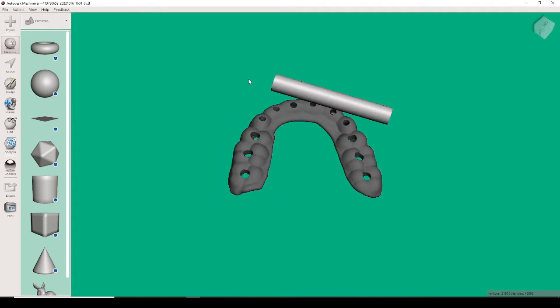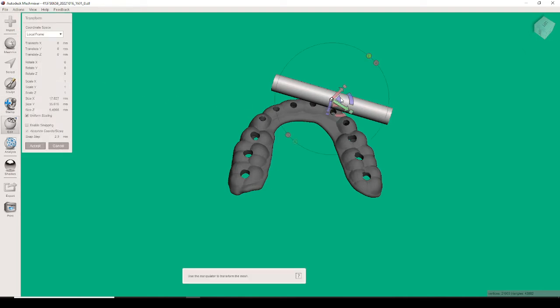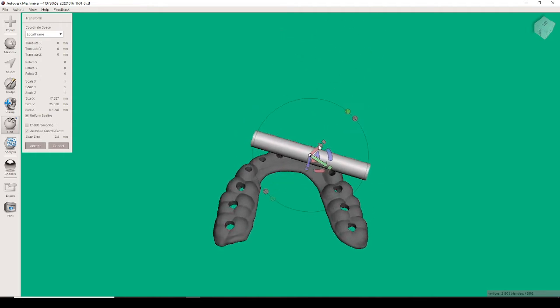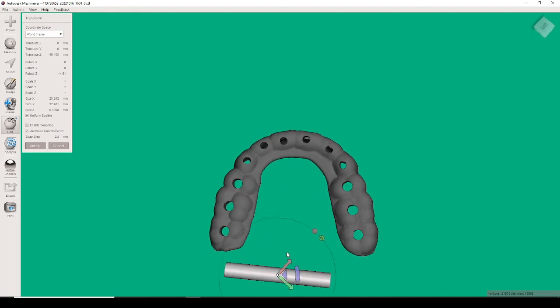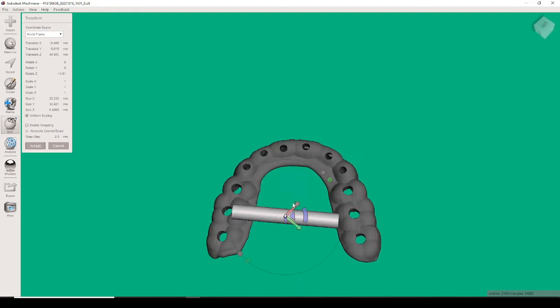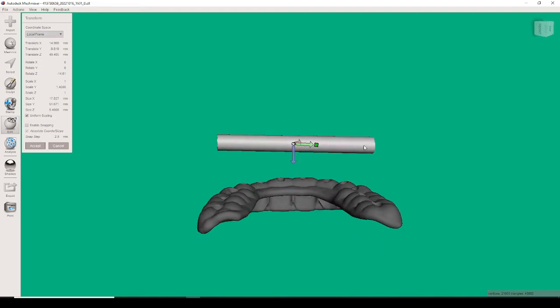All right, but for now, let's bring in this bar. So let's edit. I press T, which stands for transform. Change that to this different orientation a little bit. Bring this into the area which I want. For some reason, when I do this, it doesn't work very well.